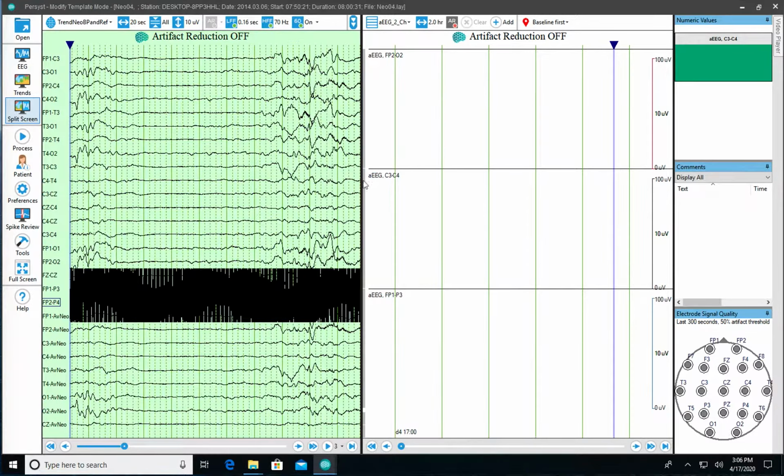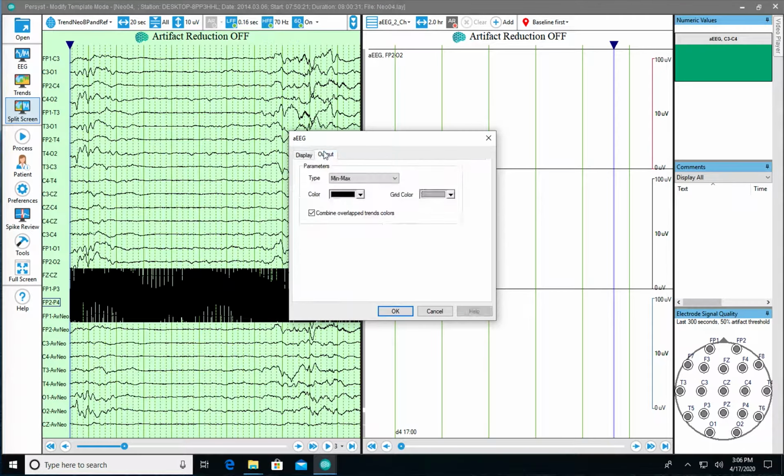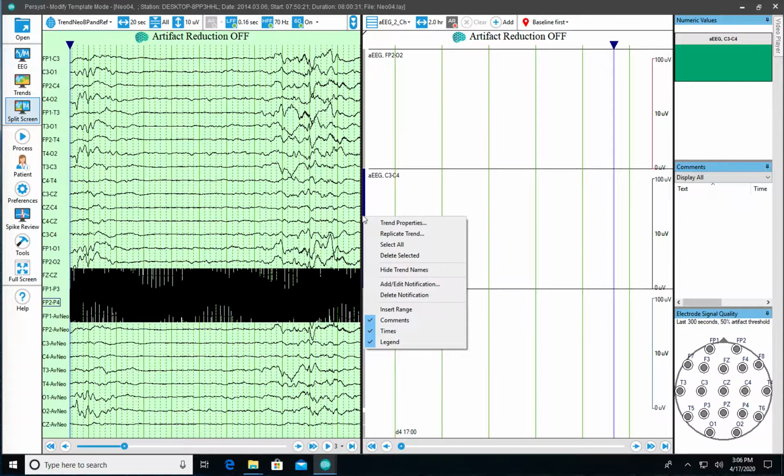So this one is rendered in black. How do I know? Because remember what it was showing before, but if you're curious, click the output tab there. It's black. I'm not going to use this one. I'm going to delete this one.